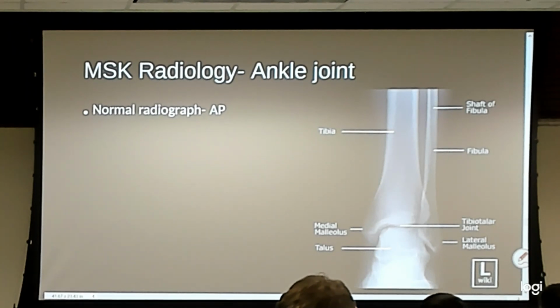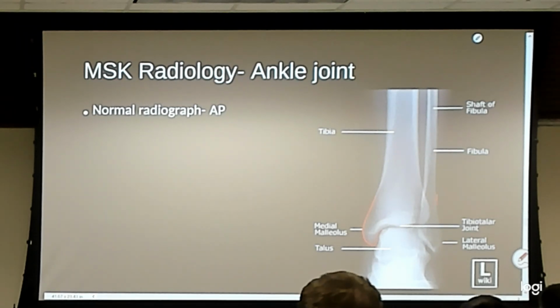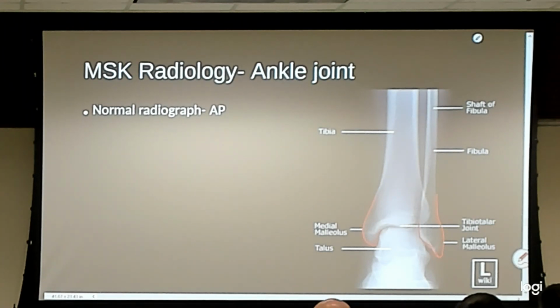Okay. So now we have another picture that we need to go over. So medial malleolus, and that's on the tibia. Lateral malleolus, fibula. I'm going to take these marks off so that I can do the talus. So the talus in this dimension should be a box, pretty close to a box. While those of you who were outlining that talus said, what's going on there? That is a something. So there's some kind of bone change there medially. Could be somebody who chronically ankle sprains. We'll learn more about that next block.